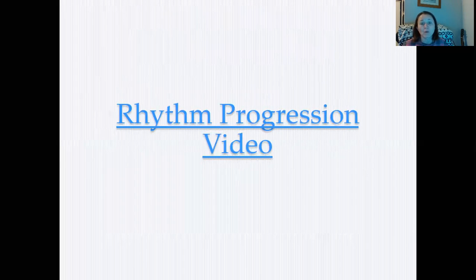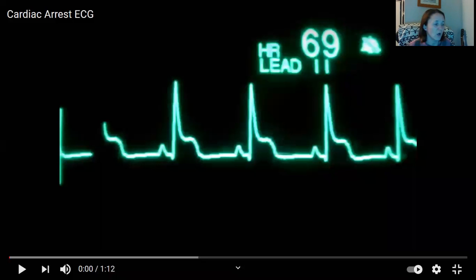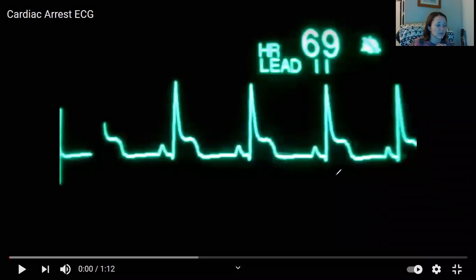All right, so I've got this little video we're going to watch on the rhythm progression, and then we're going to talk about what we're going to do when we see one of these abnormal rhythms. What are we going to do about it? All right, before I start this video, let me get my little pencil out. Some of you may have already recognized what's the problem with this rhythm.